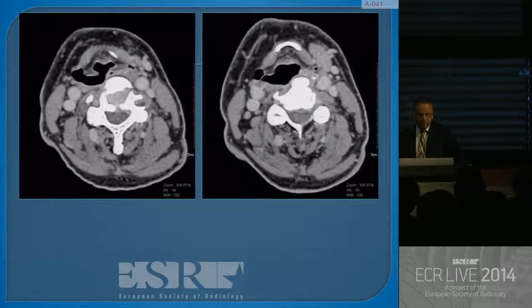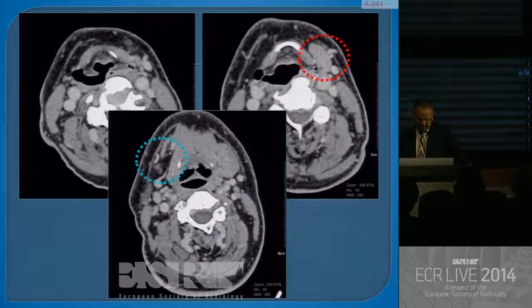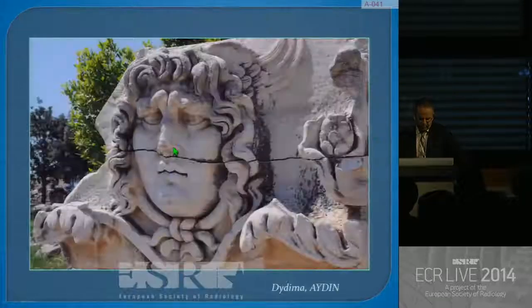But he was wrong for the left-sided mass. He called this one, the normal appearing left submandibular gland, a mass. In fact, the right was missing. It can be either a consequence of a congenital malformation, or we can see the absence because of a surgery.